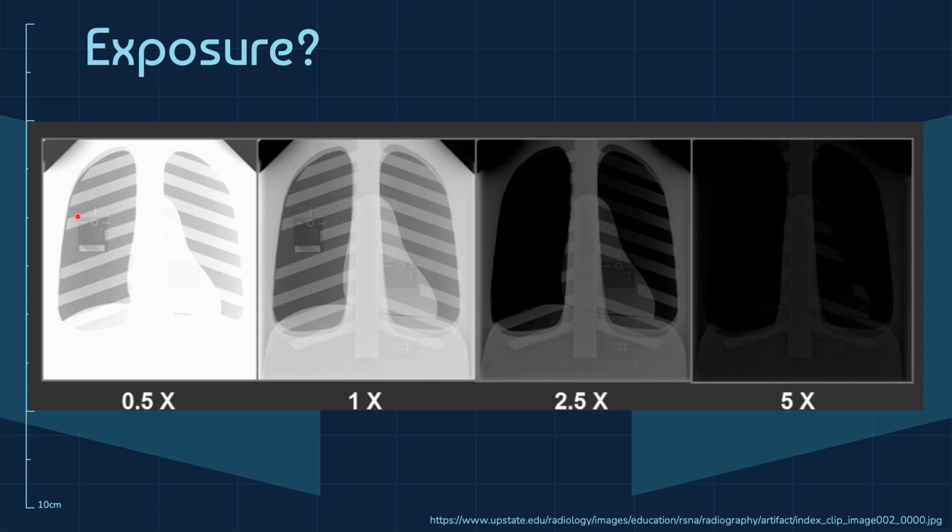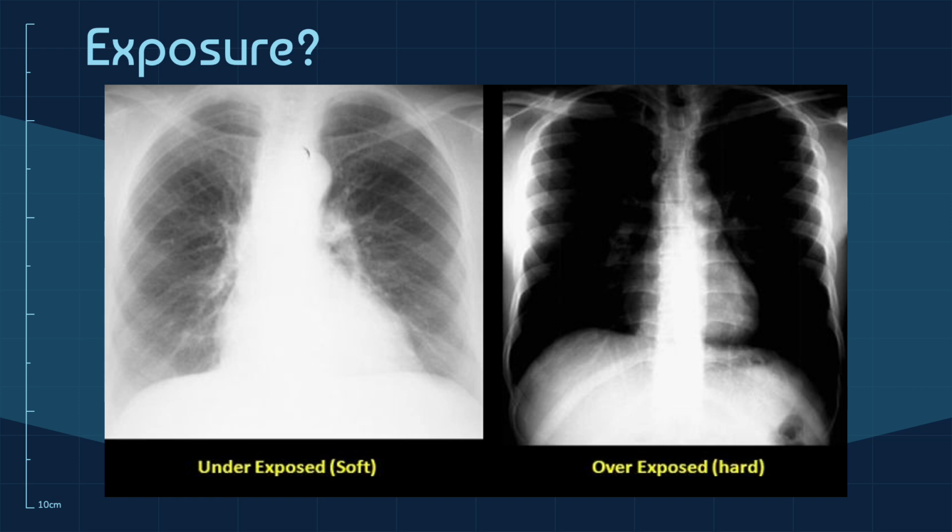For example, here you can see a tag that might be maybe in front or behind of the patient, but you can't really see the spine through the heart. And as you improve and then overexpose, you can see certain items appearing behind the heart and certain parts such as the ribs over here not appearing at all. And here is just a real life example of what underexposing versus overexposing shows. Both of these are considered inadequate X-rays.